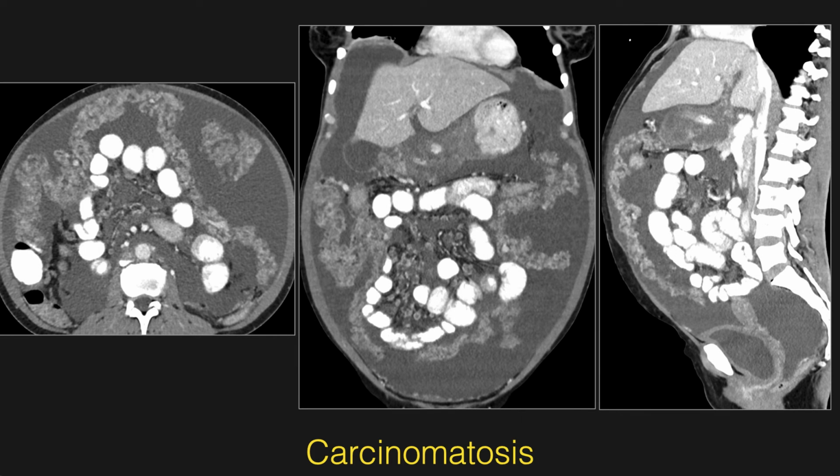And when you're dealing with gastric cancer, you must become comfortable with catching carcinomatosis in its varying presentations. It isn't always obvious, but an advanced presentation of carcinomatosis like this would certainly be a giveaway and highlights the key features to look for. Here we have ascites, extensive omental caking, and nodular infiltration of the mesentery.